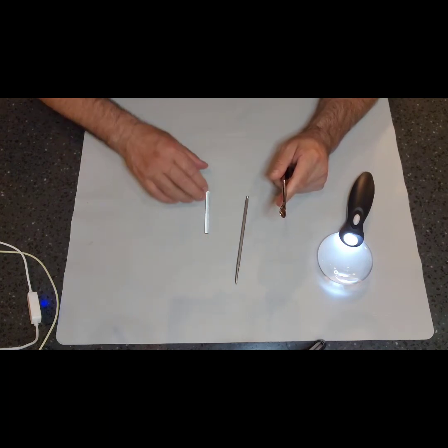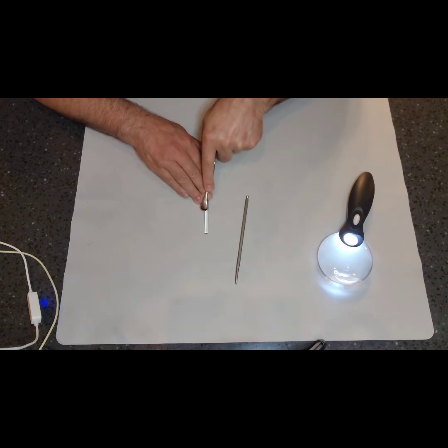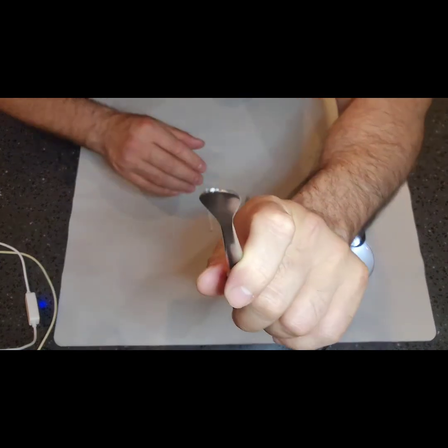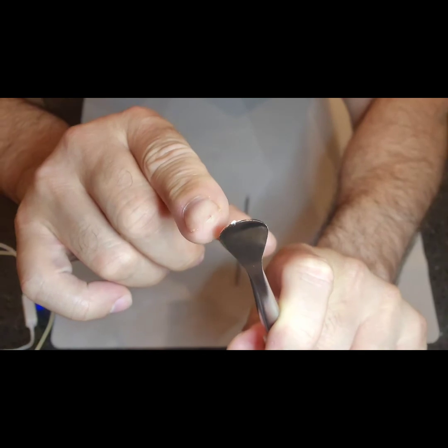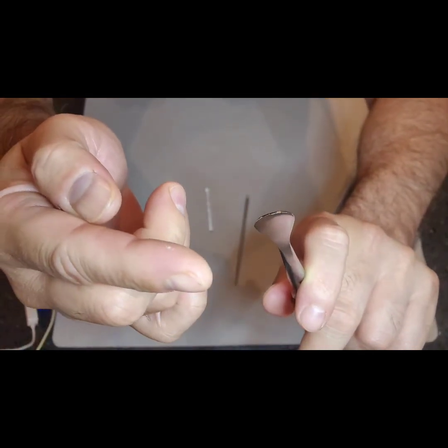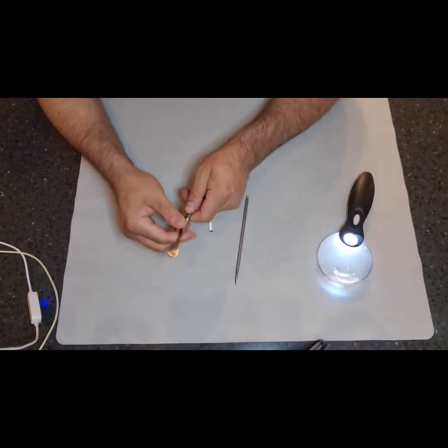Okay, you want to hold it flat and put pressure on one end, and then take the sharp end of the elevator and you're going to try and bite into that rod. You should be able to remove a small amount of this plastic dowel rod. But when you do that, guys, please make sure you recover that material, right? Okay, you don't want to have that end up in a container. So make sure that you wipe that off.